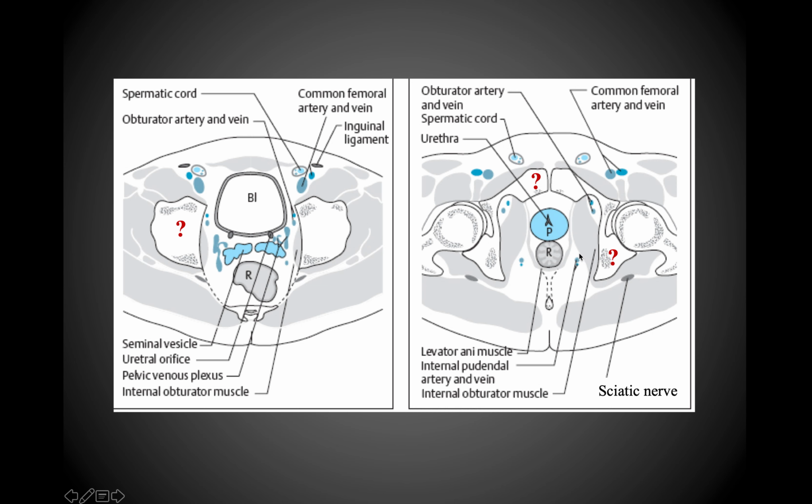So a lot of the images, when you see those, they'll be sort of right up here against the obturator internus. You can once again make out the rectum, which is still going to be filled with a combination of air and stool. The levator ani muscle can be appreciated. You can kind of see the sling, the puborectalis, wrapping around the rectum at this point.